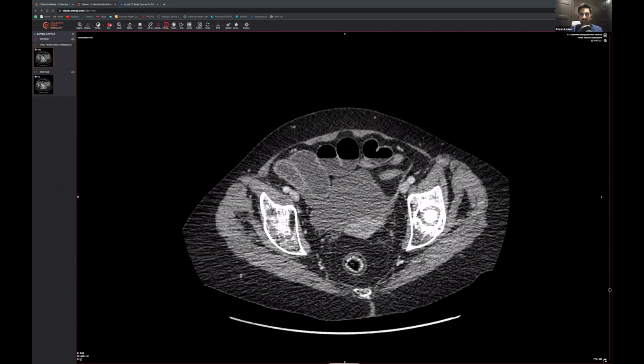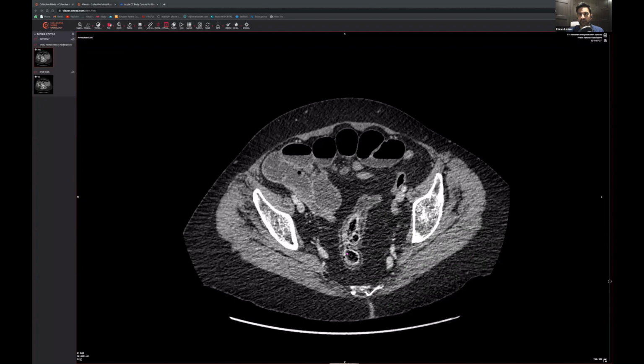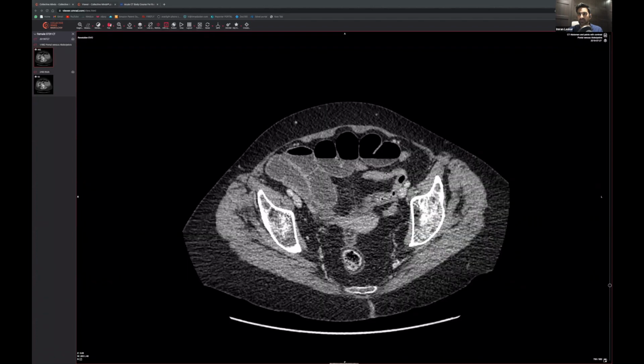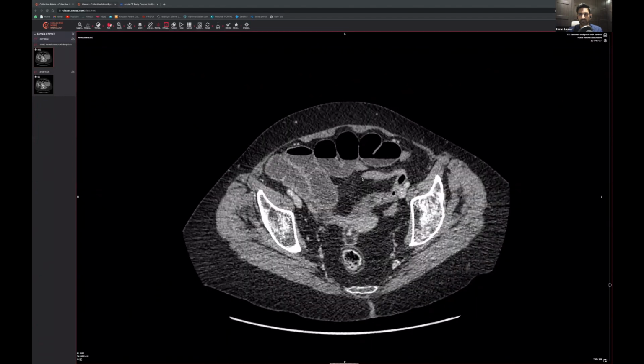That's not going to be the reason why someone's coming in with such acute pain. So then you can see here, we're going to follow along, got a bit of feces going along there like this way, going along like so. It doesn't look like there's any sort of inflammation. So all the fat, there's no fat stranding. We're coming up this way, this way, this way. Can everyone see that? Hopefully you can follow with me. Follow along. Any more answers?